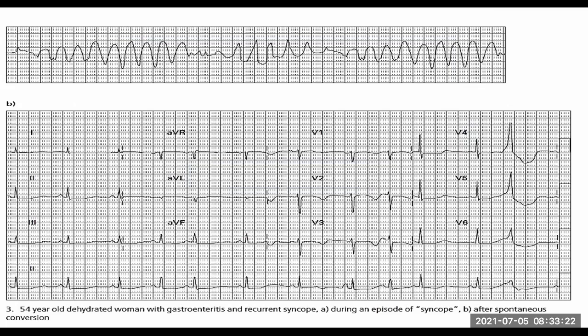What do we notice? Is there anything to pick up? Anything that seems strange? Anything that seems abnormal to you? There's one thing you should be picking up because you've got a P, Q, R, S. And what's missing? Yeah, you're not getting any T waves over there. The T waves are flattened. All right. So that's abnormal. You shouldn't have them. All right. So that's one thing that you could pick up. You could argue that there's maybe a little ST depression, but it could also just be a slight slant or things that we're not picking up. But anyway, that we'll get back to in a second.